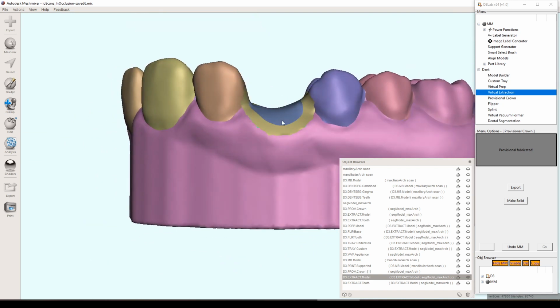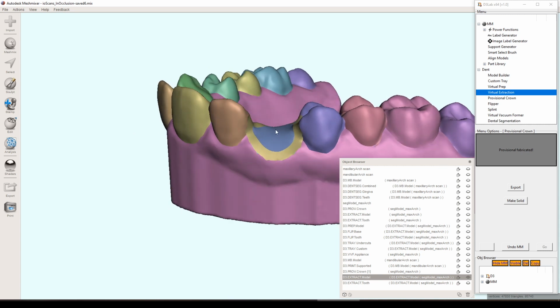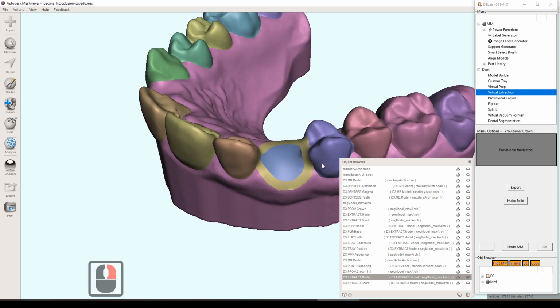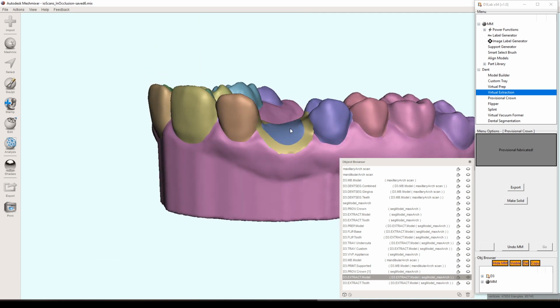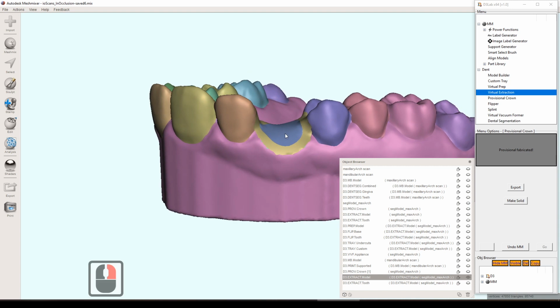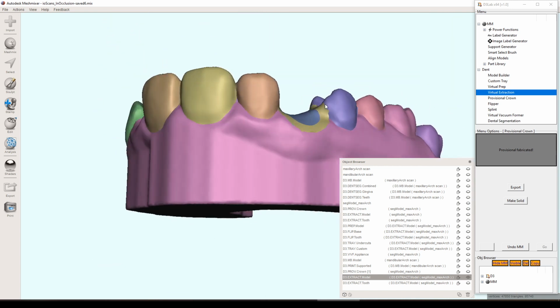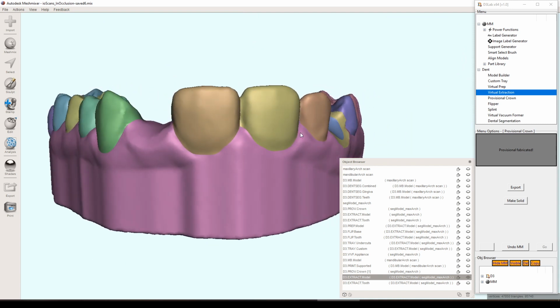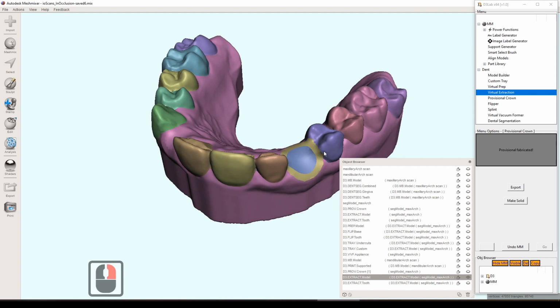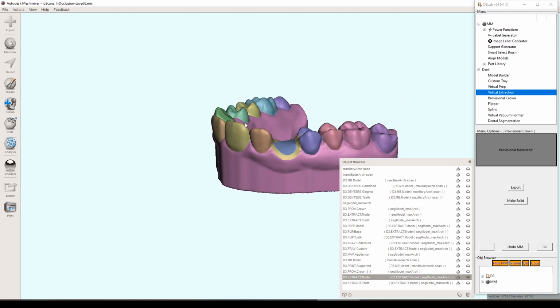But that actually is quite a bit of sitting there and figuring out the best ways to keep the adjacent teeth anatomy while also trying to replicate a little bit of an indented socket there, the best you could for a virtual type of extraction. And I feel like even on really high res, very detailed models with a lot of weird curves to the teeth and rotations, it does an excellent job of maintaining anatomy even after you do extraction.